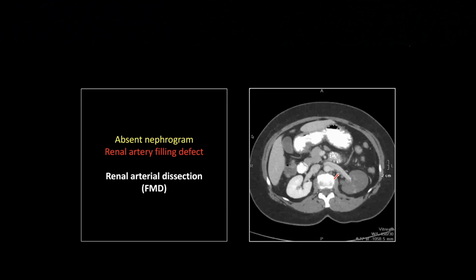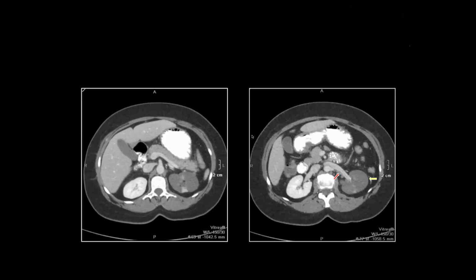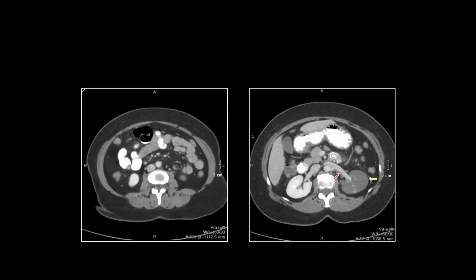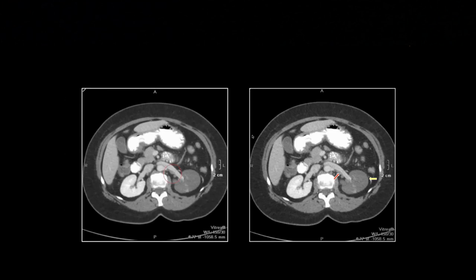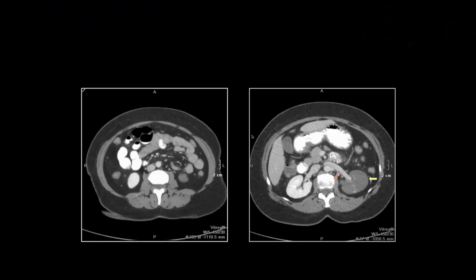And if you look real carefully at that left renal artery, you can see it actually is a bit of a corkscrew. It's got a little bit of a circuitous course to it there distally, and that is the classic appearance of FMD, fibromuscular dysplasia. And there you can see that little squiggle of the left renal artery. And so what this was a dissection. Patients with FMD are at risk for renal artery dissections, and the renal arteries, of course, are a favorite place for FMD to involve.